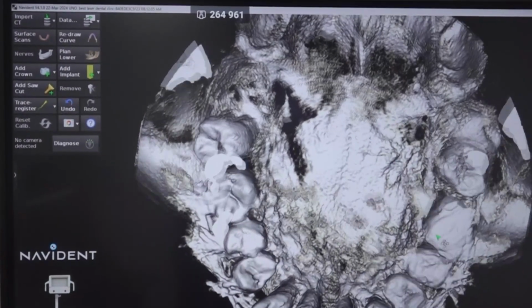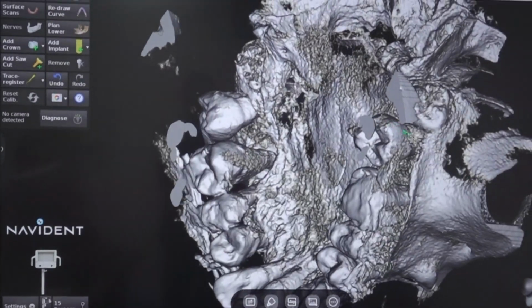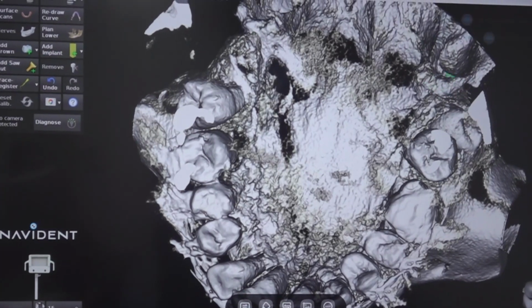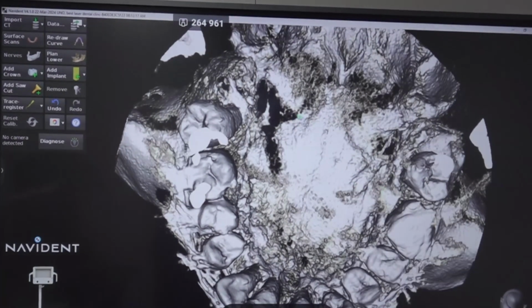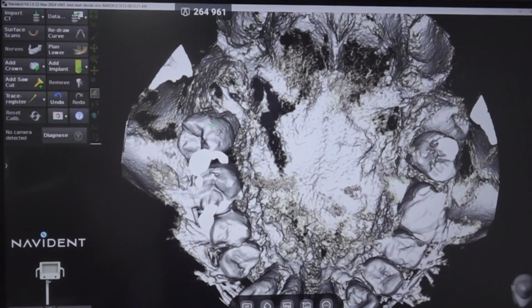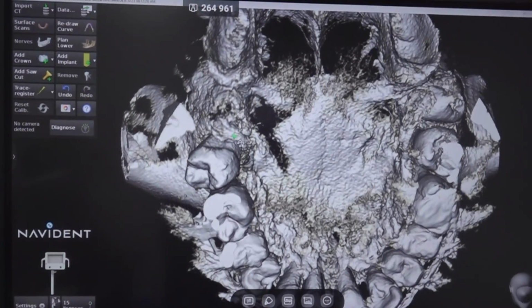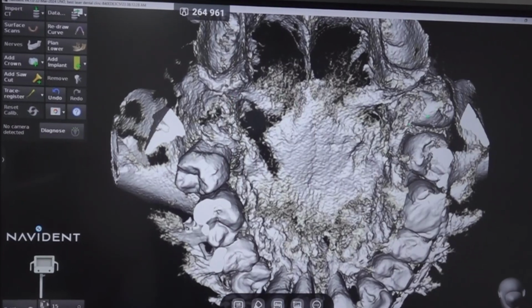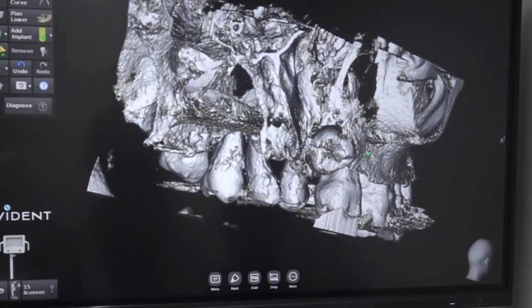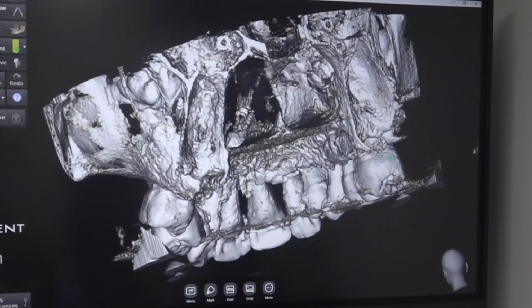So this is the pterygoid here. See the 8 is bucked out here, right? After the 8, the pterygoid junction is near. But here, after you remove this 8, the pterygoid is a little far away because the 8 has easily migrated. See the amount of palatal bone loss in 2-6, right?